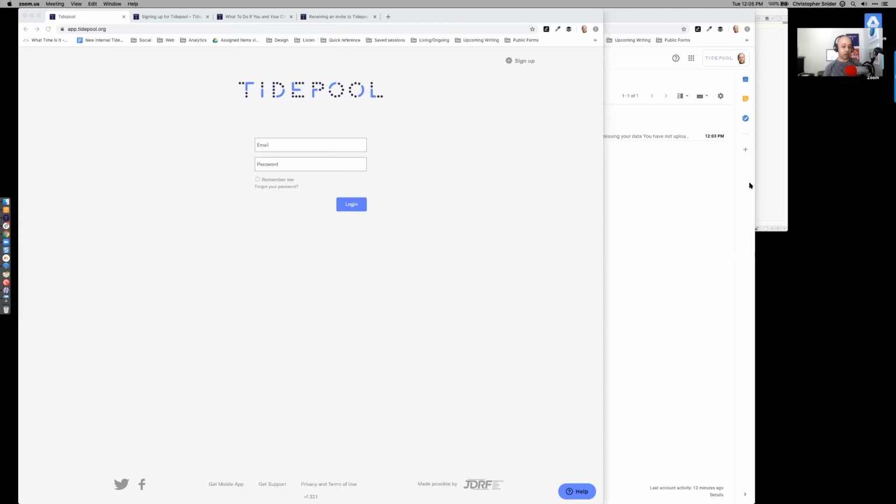tidepool.org/signup is where you need to go to ultimately sign up for your Tidepool account. Chances are, if you're actually watching this webinar, you might be familiar with this process because you've already created your Tidepool account. But just in case you aren't, and you're new to this whole experience, I'm going to walk you through all of this and where to go from there.